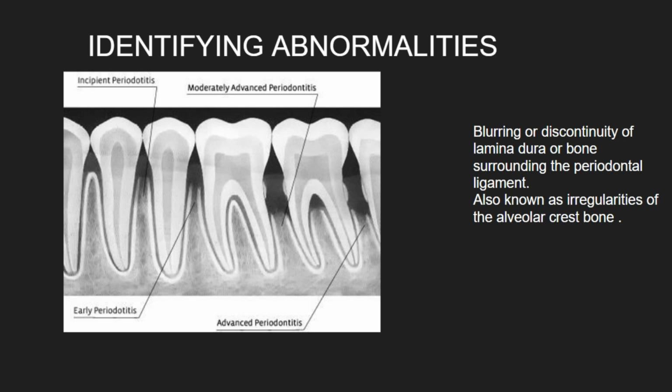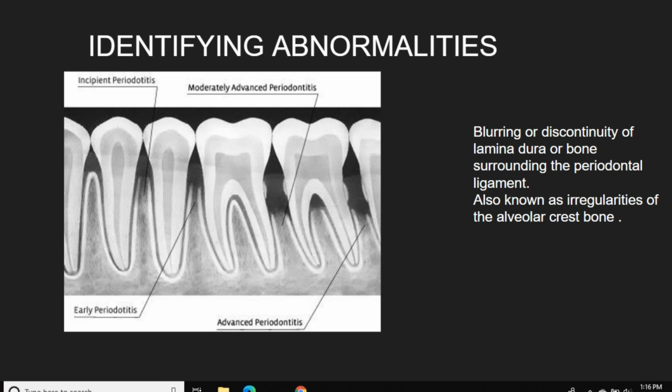So, periodontal disease we know is inflammation of the gums, or more advanced gum disease. It can create bone loss, or that's part of the way we diagnose it. And it can be viewed a couple different ways or at a couple different levels on a radiograph. And the first thing I want to point out is this tooth right here. That is what your normal periodontal attachment or periodontal apparatus should look like.